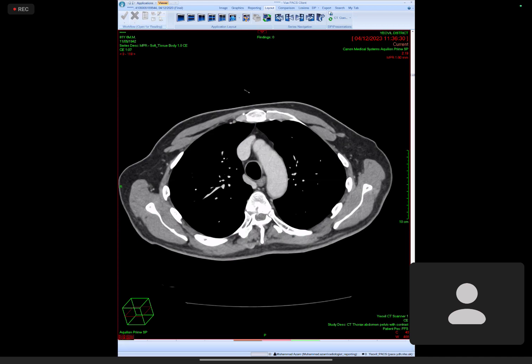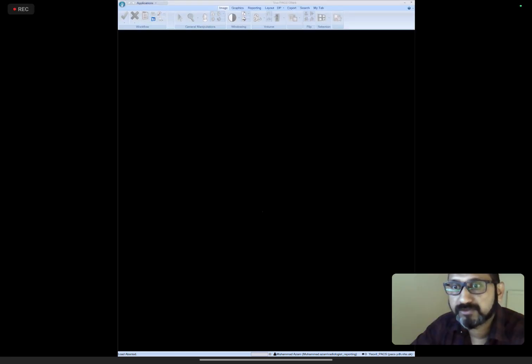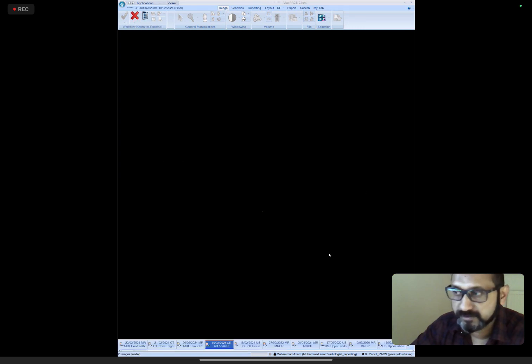Okay. So very quickly we'll go to some other case, maybe one or two, and then we will wind up. And I would give you some rapid reporting sort of things. Okay, and here we have one patient.